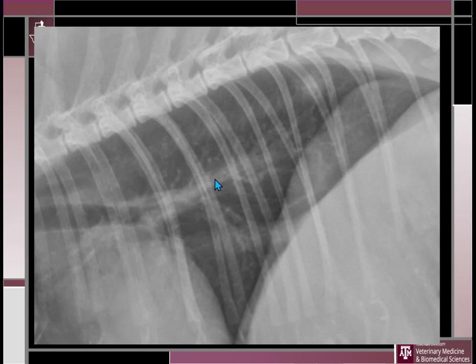These little nodules are smaller, but notice how there are vessels that can be traced past them. So these are end-on pulmonary vessels. And so make sure that you're not looking at an end-on vessel when you call pulmonary nodules. So check and see if there are vessels that are adjacent to it that are very similar in size. Versus this guy is much smaller, or much larger, than the pulmonary vasculature around it.